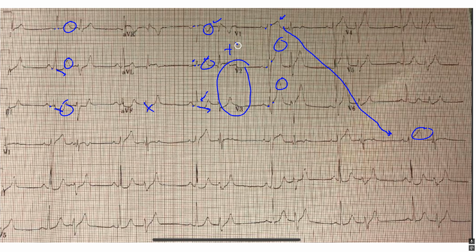Okay, we have more than 2.5 in the precordial leads. That doesn't matter if you're a man, if you're a woman, if you're over 40 or under 40. That's going to qualify for everybody. Over here in V4, 5, and 6, I do see J point deviation, more than 1 millimeter, hyperacute T wave. V5, J point deviation, more than 1 millimeter, hyperacute T wave.